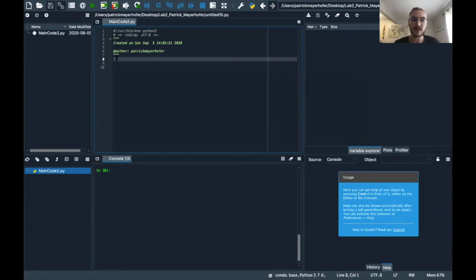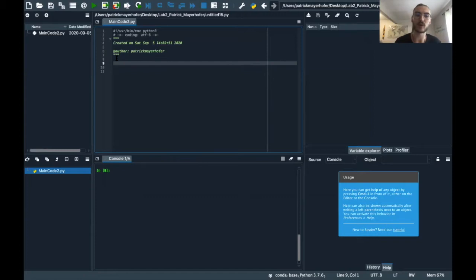If you can remember last time in our Lab 1, we imported some different libraries. Like for example, we imported pandas as, in that case, PD. So the pandas library gave us different functions that we could then use, like for example, the CSV import function. What we can do is we can also write a library like this by ourselves. And I want to show to you guys now how this works.